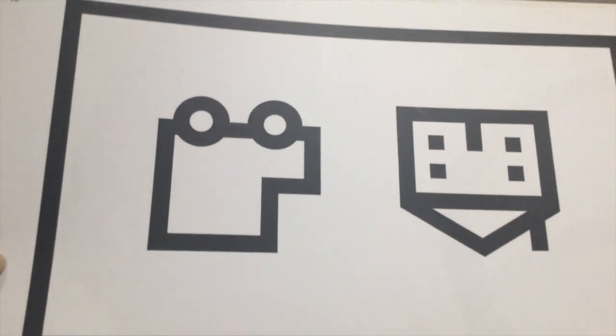But let's just imagine for a moment that the child only gets one symbol. So on the page that's facing me, remember the truck and the house, I know they're going to be upside down, are on the opposite side. We have this box in the corner. I hope you can see that. Now it's the same on every page. Now remember, there were only 2 pictures on the opposite side. The house and the truck, there they are, they're still there. Nothing up my sleeve.